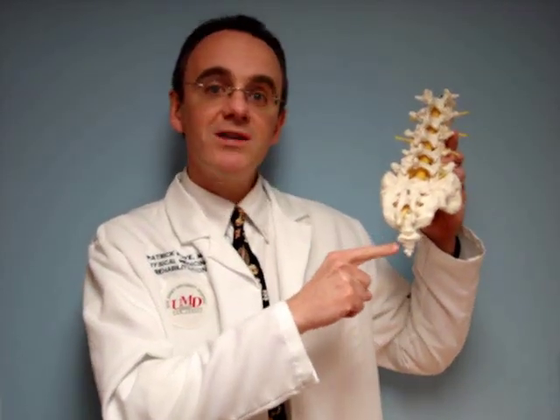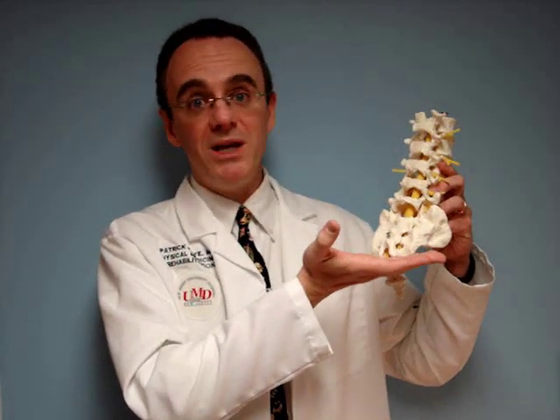The other thing you can do is to actually get a copy of the images to look at yourself or to look at with your doctor. Usually an MRI facility will be able to either burn the images onto a CD for you or give you the actual printed images that they can loan you, and you can either look at them at home or, better yet, take them with you to your doctor's visit and specifically ask your doctor if he or she can point to the coccyx on some of the images so that you can actually see where the coccyx is included. And be prepared to be surprised because it's very common that the coccyx won't be included at all.